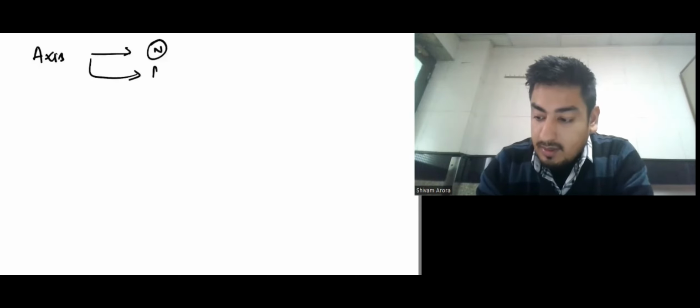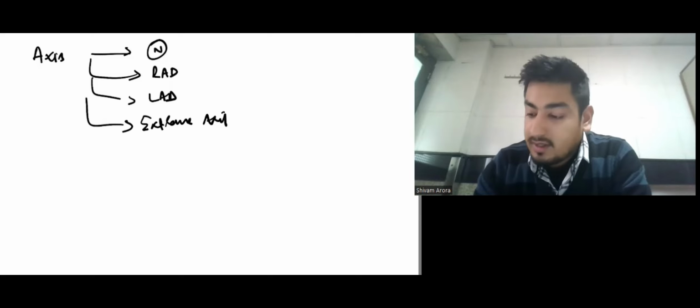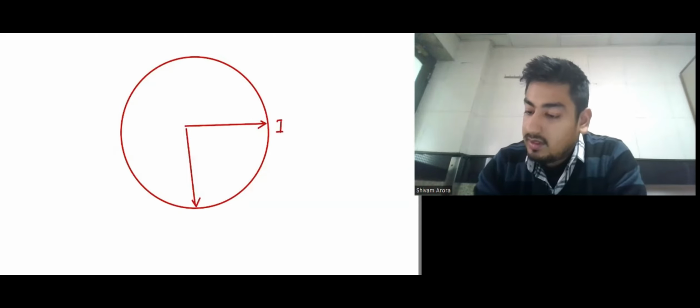Okay. Now after the abnormalities of rhythm, third thing to look at is axis. So axis can be normal, can be right axis, can be left axis, and can be extreme axis deviation. So how will we look at this? For axis we use two leads. This is lead 1 and this is lead AVF.